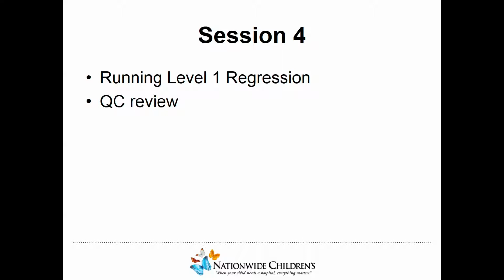That's our models that we run for each individual subject. I'd like to start out today by going through and showing you visually what actually happens in each of our steps. So we'll be taking a look a little bit in AFNI about what happened exactly in our session. And then the majority of the time I'd like to spend running through some basics of QC review. There's a very nice tool that AFNI has that helps to automate some of the more basic processes.